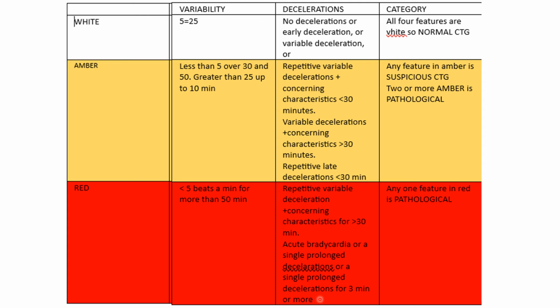So here we see that there are 4 important signs that there is either tachycardia or there is an increase in the baseline, as was seen earlier, or if there is a deceleration and this deceleration is especially variable and prolonged and continuing, and in addition to all that, the variability is reduced or highly increased. These are all dangerous signs indicating that there is a high risk situation.